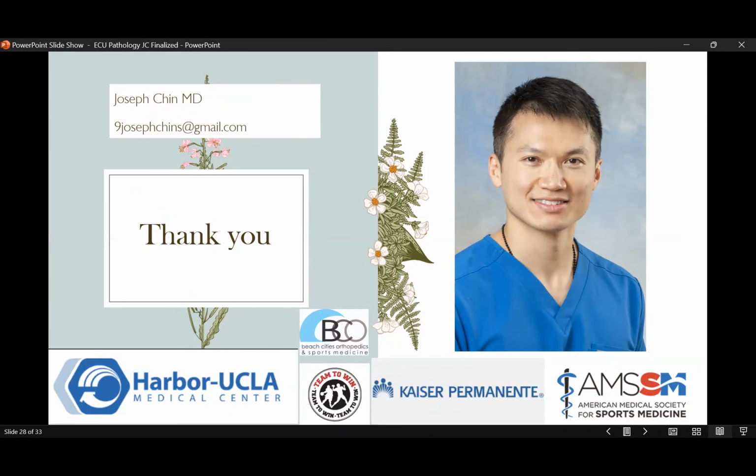And I noticed you had that article up. It's been well vetted that up to 50%, sometimes even a little more, of subluxation is normal with supination in some individuals. Because the ECU is part of my dorsal protocol, I have learned over time that ECU longitudinal tears or clefts are very common.